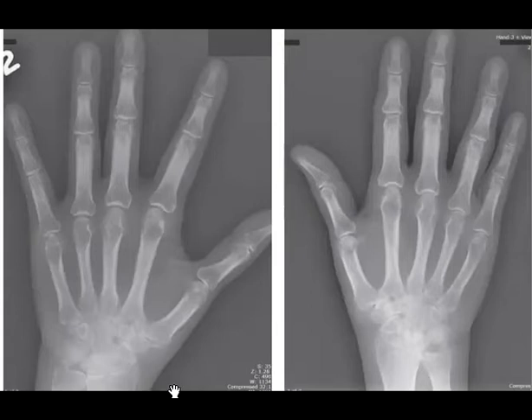Psoriasis involves the distal joints. And what else about the bone density? Bone density is normal. Yeah, most in the early cases are normal. So there is also periostitis. So yeah, pencil in cup appearance. Perfect. Yeah, and it has many characteristics.